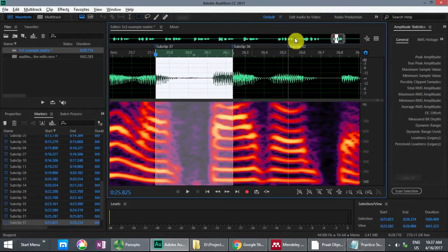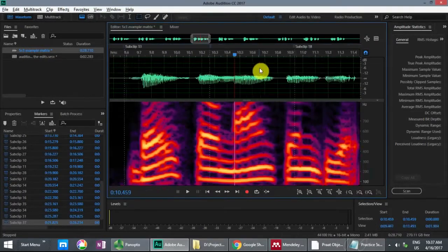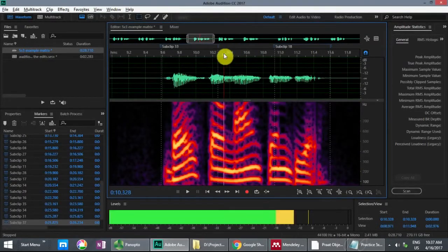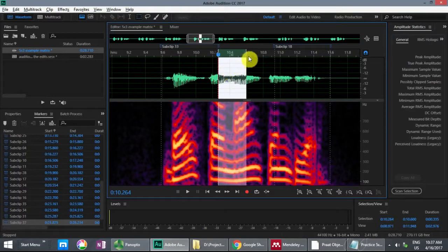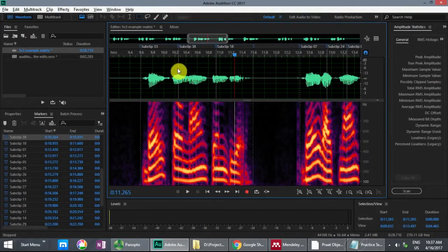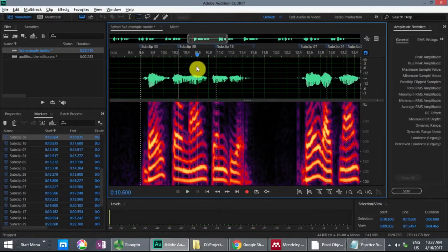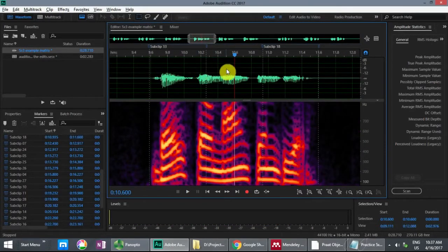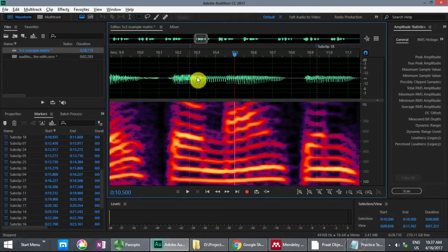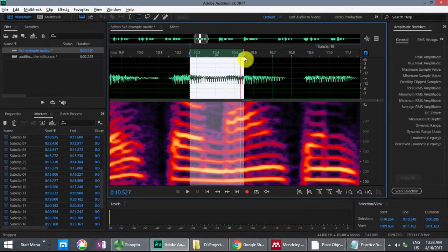And then we had number 4. We're just missing this little piece here. Barry stole 9 thin deer. Oh, we actually had 2 pieces there as well. Stole 9.